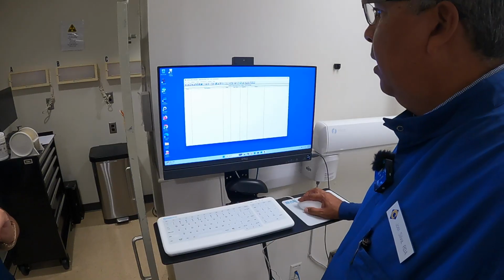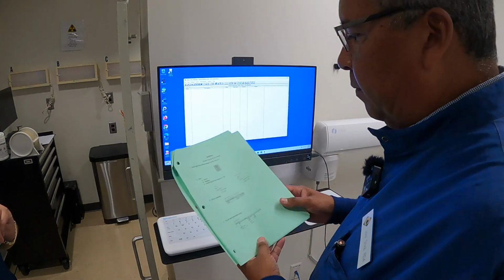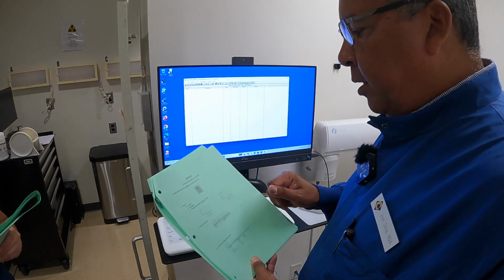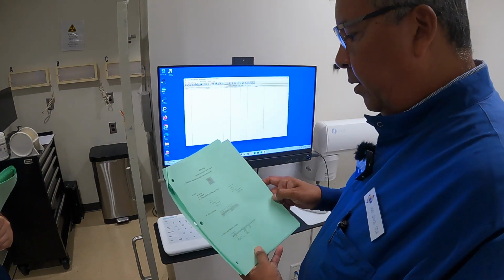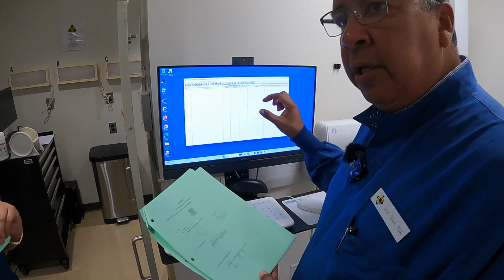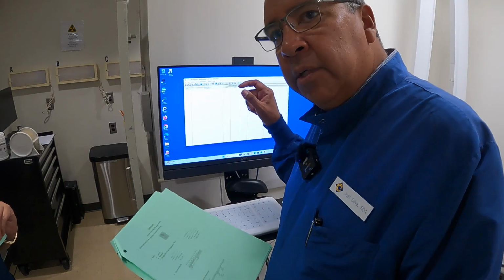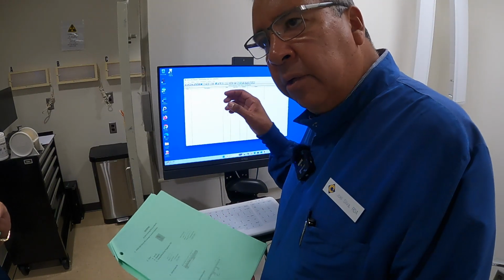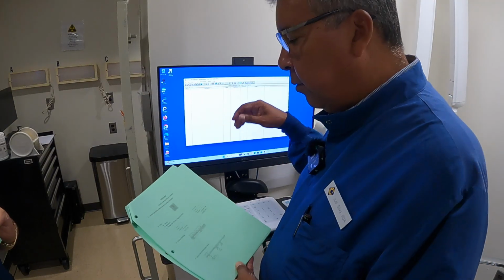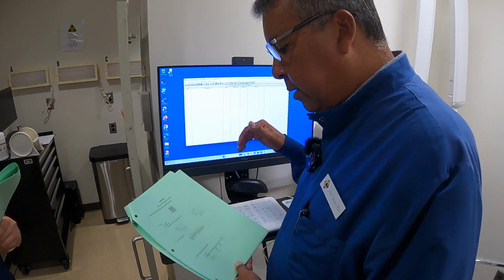Okay, so, we can follow this portion of it right here. So you're going to get into Enterprise. You already entered your user ID and your password. And at the initial beginning, I don't know if you saw, I typed in DA because dental hygiene has their clinic too. So there says dental hygiene. So you want to make sure that you're actually physically typing DA to get into yours. So username, password, and then DA.